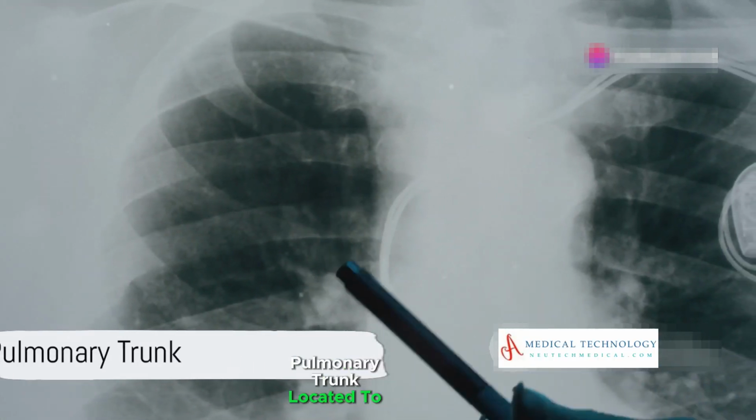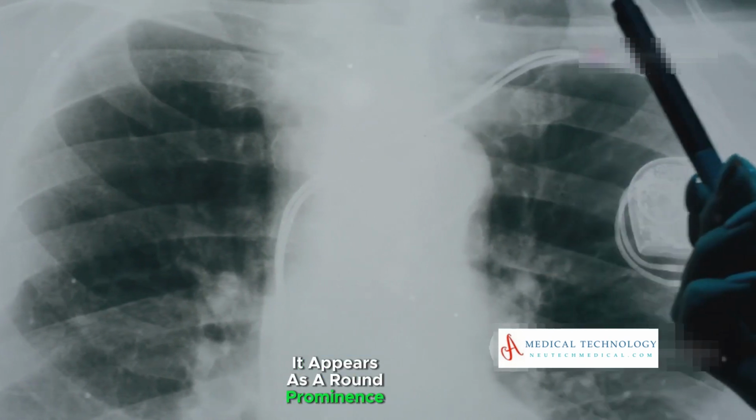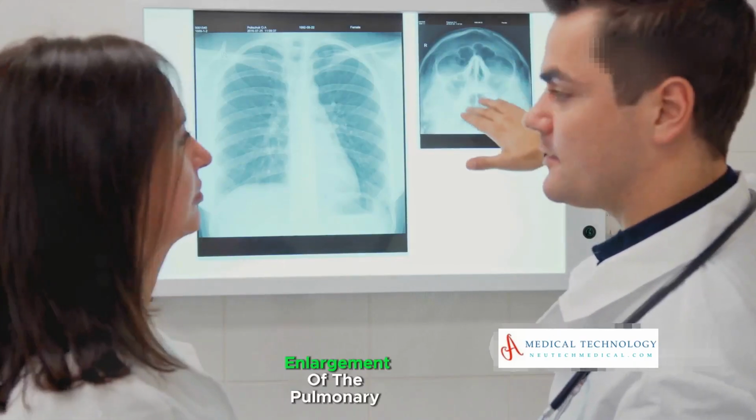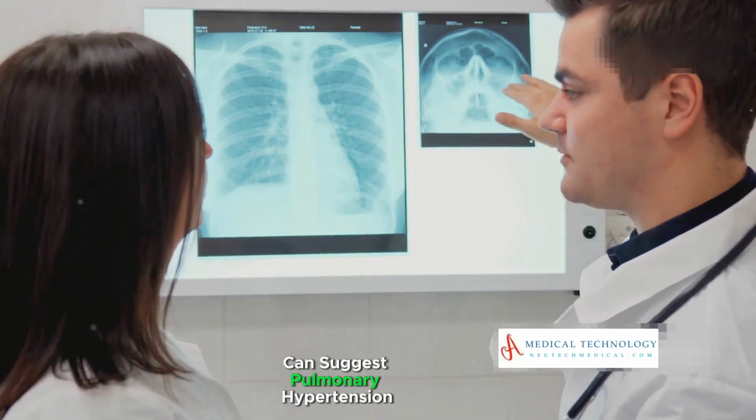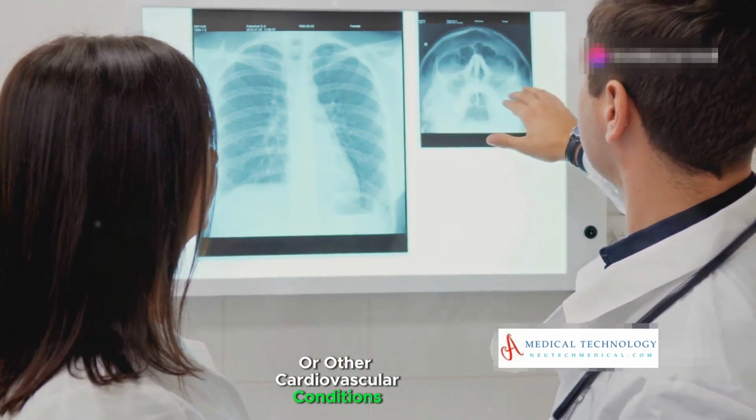Pulmonary trunk. Located to the left of the midline and below the aortic knob, it appears as a round prominence. Significance: enlargement of the pulmonary trunk can suggest pulmonary hypertension, congenital heart disease, or other cardiovascular conditions.